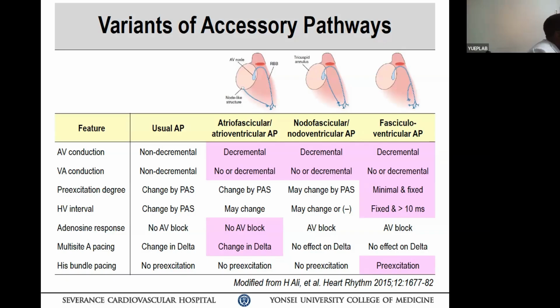And we observed augmentation of the delta wave during the pacing, after S2 the delta wave was much more augmented. So it's against the basic electrophysiology. However, when we tried to pace the His bundle, the delta wave widened.